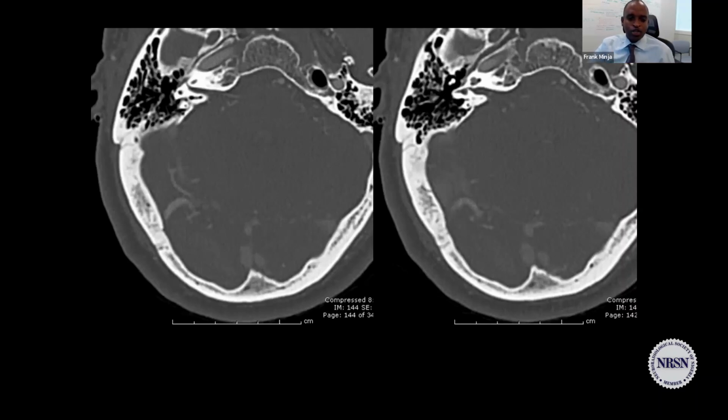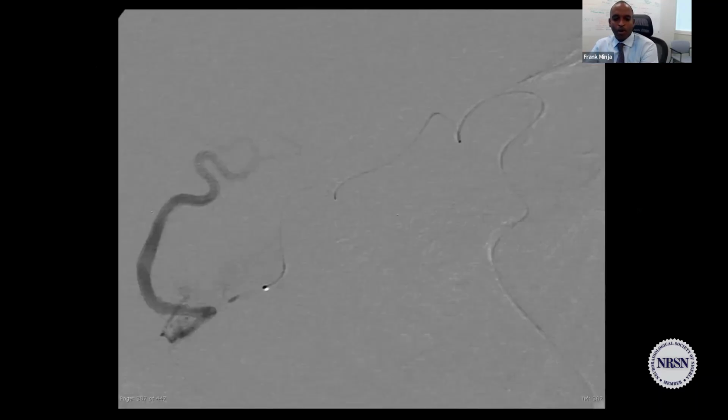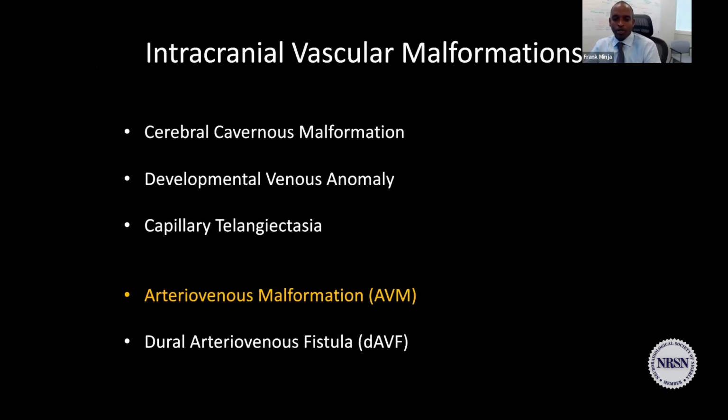Your thought process is correct, but I think it's very important to understand that a dural AV fistula typically happens within the dural venous sinus. So you have to say that that culprit lesion is in the dural venous sinus. I think maybe that's one point. But I'll show you another case where we have a really prominent cortical venous drainage to kind of hammer home that particular point.